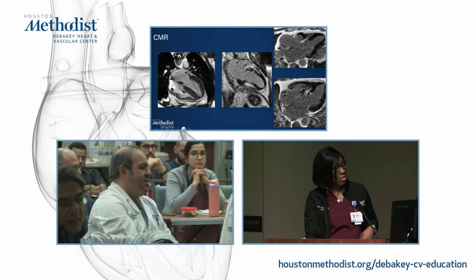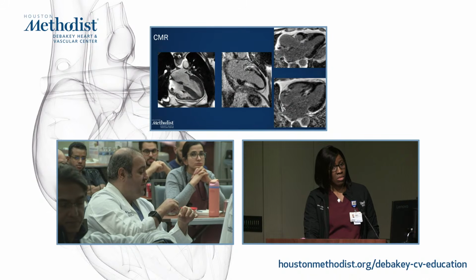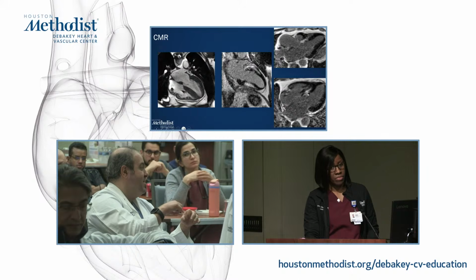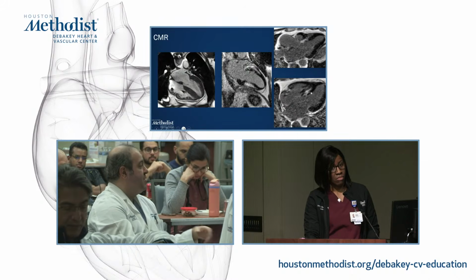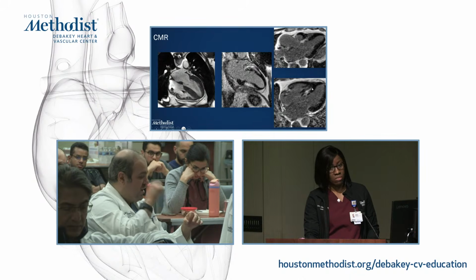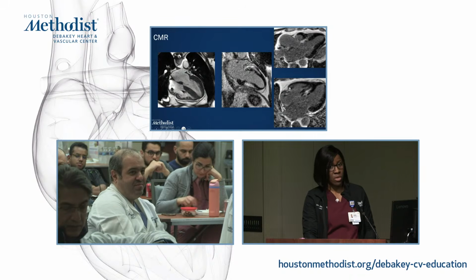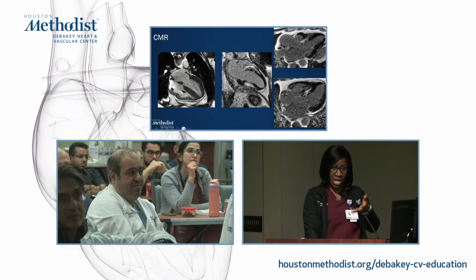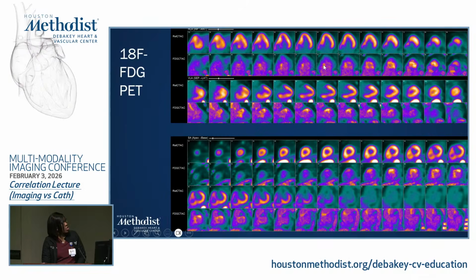And most importantly, in the acute ablation setting, typically you're going to see a transmural scar tissue, and a lot of the time you actually see evidence of microvascular obstruction, because there's a hard time for the gadolinium to go inside those areas that are ablated, because you're creating acute myocardial necrosis and an infarction type of pattern. So if you're imaging someone acutely within 24 or 48 hours, typically you're going to see a transmural enhancement, and in the center you'll see a black area, which is very similar to a microvascular obstruction phenomenon. And indeed, in the MRI report, it was mentioned that there is a focus in the very basal septum with the MVO appearance that was thought to be from the previous recent ablation.